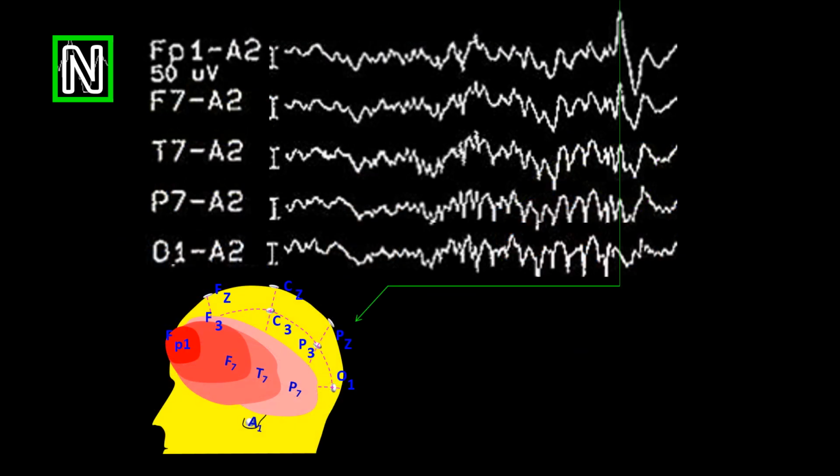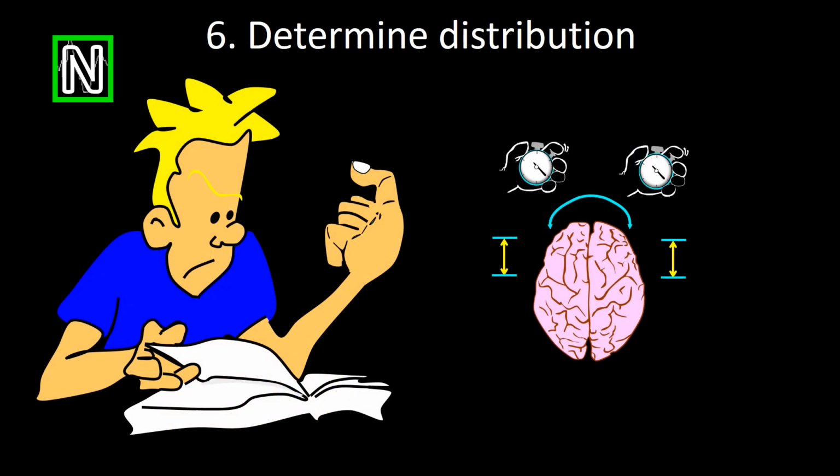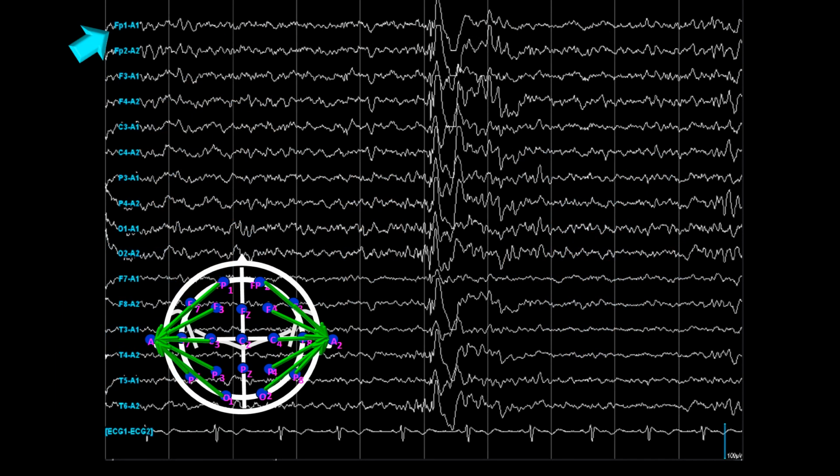This negative discharge is often followed by a positive field discharge. The activity is synchronous and symmetrical. I have introduced this frame to show you the generalized distribution with the frontal predominance. Here the arrow is pointing to the left frontal region and here to the right frontal region.